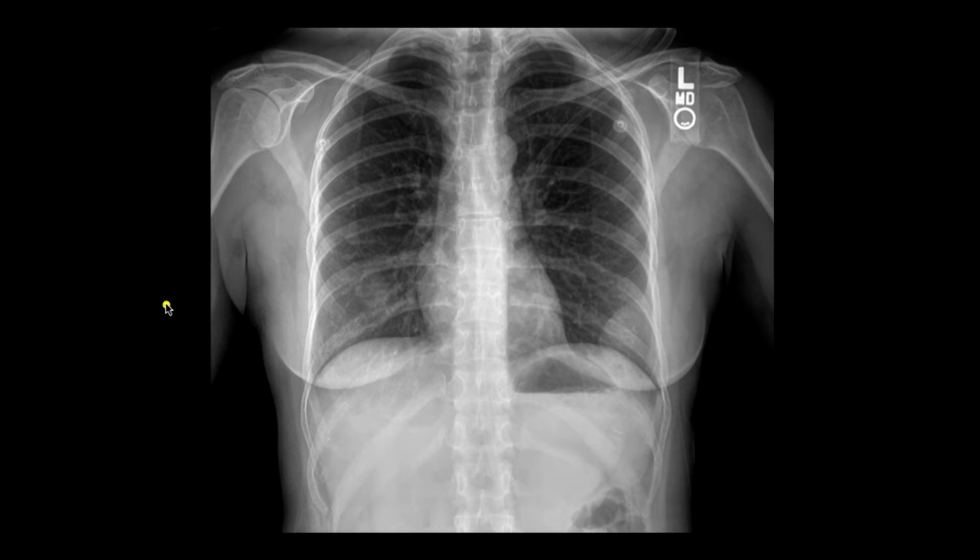So this patient, if you look at the right base, you can see a vague rounded structure here. And so I'm just going to draw around that. But the patient has a lung mass. And if you look carefully on the left side, you can see this smooth-walled mass along the chest wall. And if you're just following this rib round, if we're looking at the anterior margins of the ribs, you can see an anterior margin of the rib coming down now.